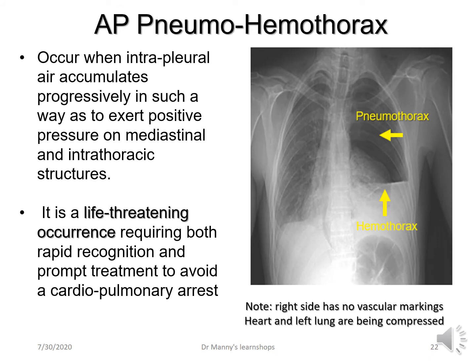Even though hemothorax is part of the radio-opaque X-ray, I've just included here just to give you an idea. So this is a combined Pneumo-Hemothorax. And as you can see with the hemothorax, this must have been taken in the erect position or the semi-erect position as an AP film. And you can see the fluid level for the hemothorax.